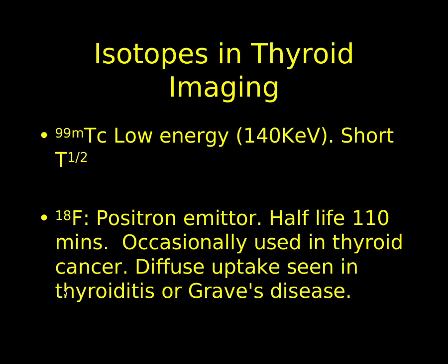Now, they may not be very significant cancers, and the patient's other condition that they're being scanned for may supersede that, but we certainly do want to mention that it might well be a thyroid cancer, and the clinician can take the appropriate action depending on the clinical circumstances. Clearly, if the patient has widespread metastatic disease from a lung cancer, it may not be appropriate to image it.